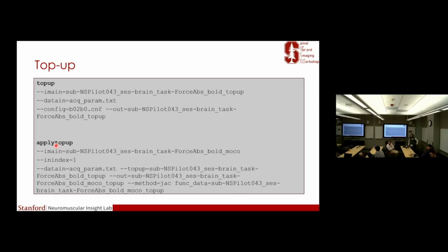But when I look at the spinal cord images, I think maybe it's smaller. Those distortions are less obvious. And I think also, since during the registration we do non-linear registration, we kind of compensate for those distortions in the spinal cord during registration to template. So it's just adding extra steps.